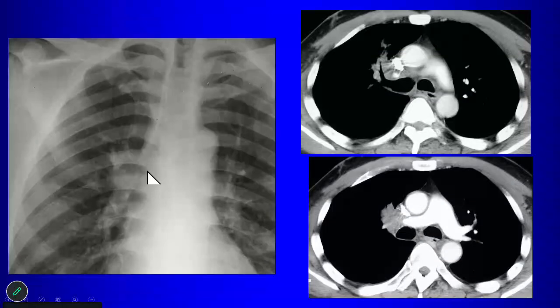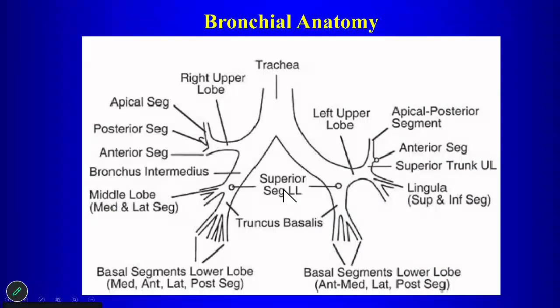That accounts for what we're seeing there, okay? And this turned out to be lung cancer, all right? So it's a subtle case of right hilar lymphadenopathy that you can really see on the chest radiograph, especially if you compare with the prior studies.